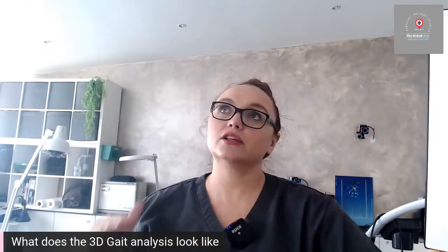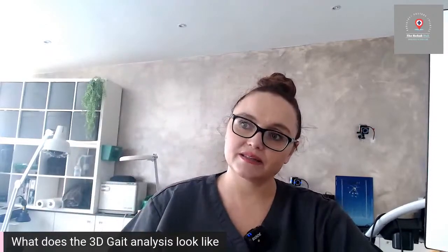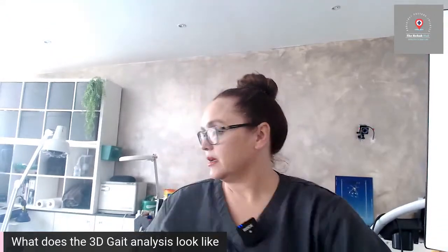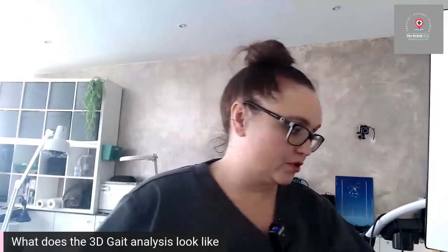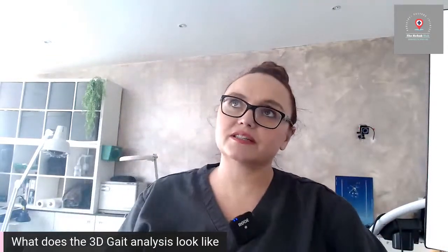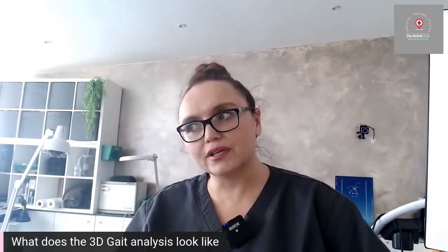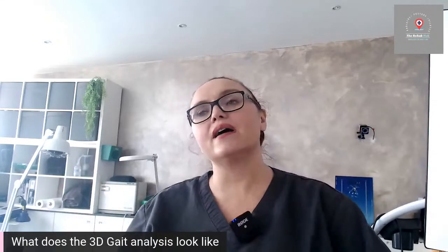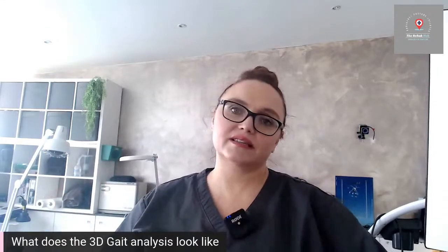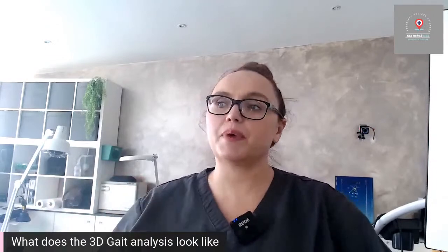You'd have to look at all those different joints at the same time and analyse in frontal, sagittal and transverse planes. It just isn't possible. There's just no way you can do that. So what our gait analysis system does is it takes something that's subjective, or looks like you're doing that, takes all that guesswork away and actually gives you accurate data: this is exactly what your body's doing. And with that, you've then got choices, you've then got power, you know what's going on.